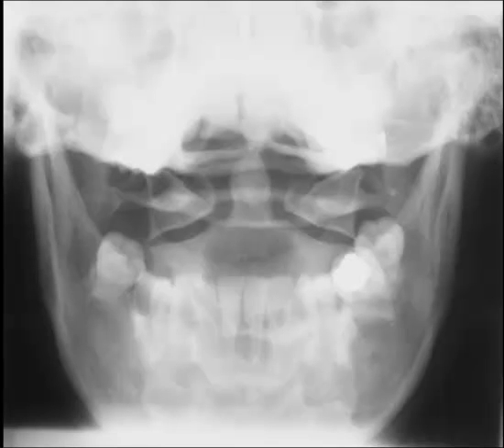I specialize in musculoskeletal radiology, and today we're going to do a brief tutorial on the cervical spine anatomy of the atypical cervical vertebrae. A standard series will include an AP open mouth projection, which we're visualizing right now, an AP cervical projection, as well as a lateral cervical neutral projection.